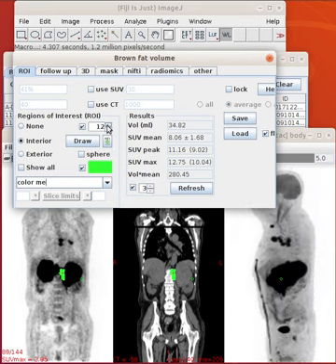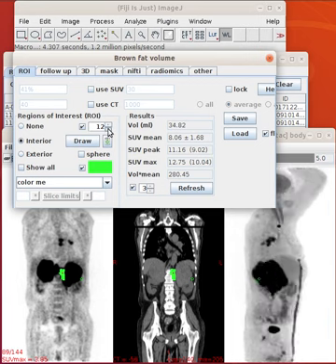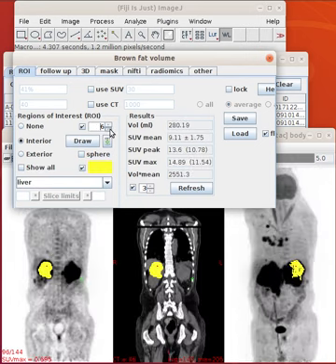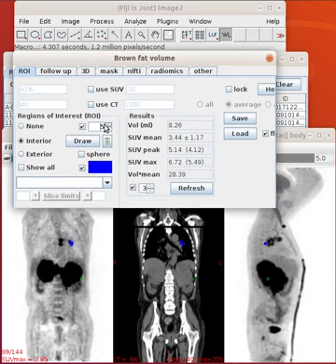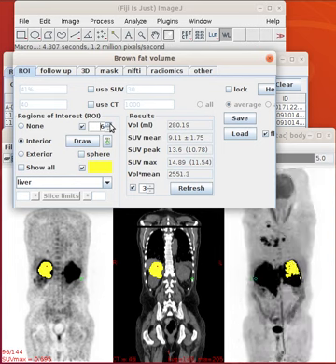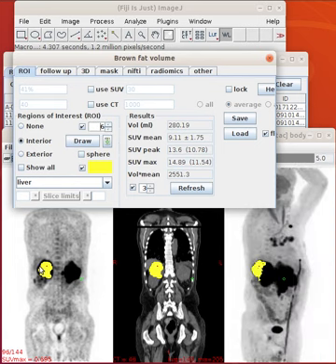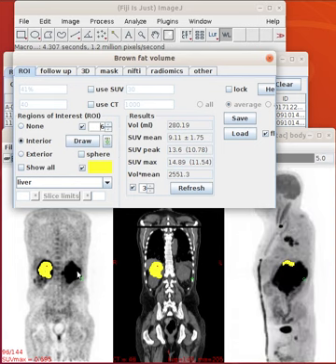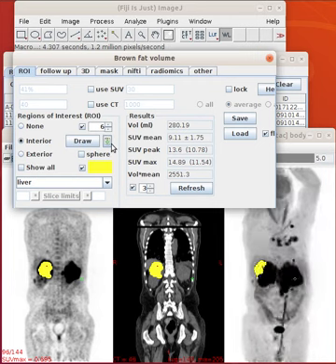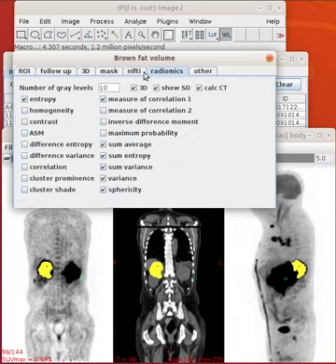So I'll go through. I want to go back. I know 6 is my original region, so anything above that, if I see it in the liver or in the other organ, I'll eliminate. I don't need duplicates because that'll screw up my radiomics.